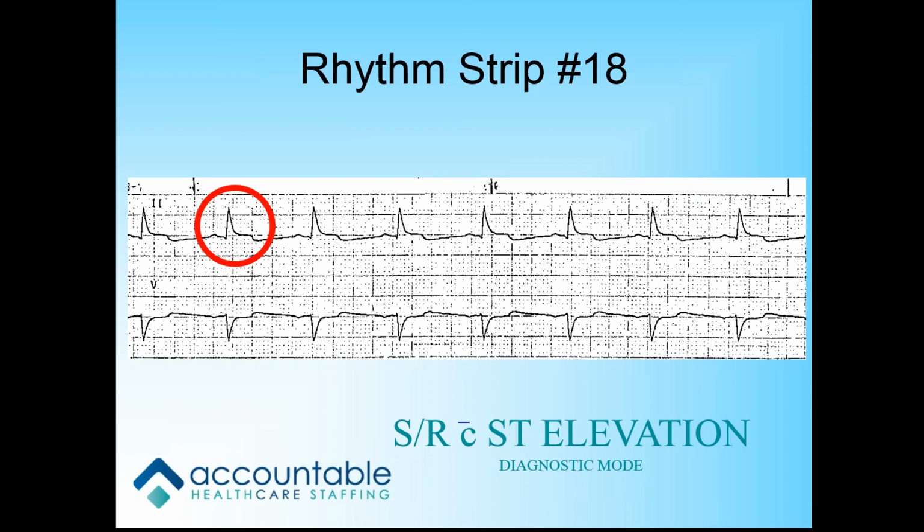Yeah. So you've got an ST segment elevation. So it's a sinus rhythm with ST segment elevation. Does everybody see how the ST is elevated a bit from the baseline? Yes. I'm going to take that as yes. So Irene, what are we going to do for this patient?